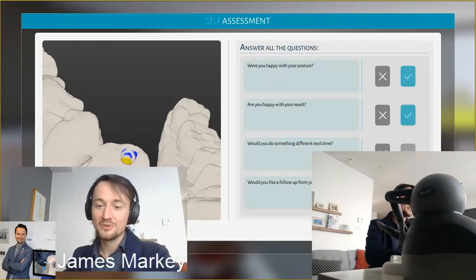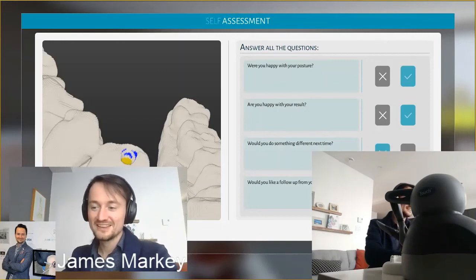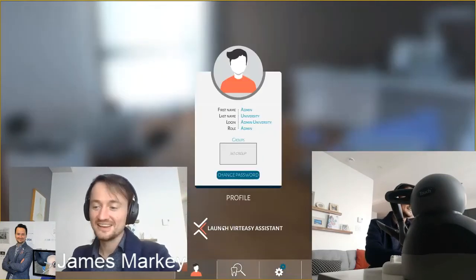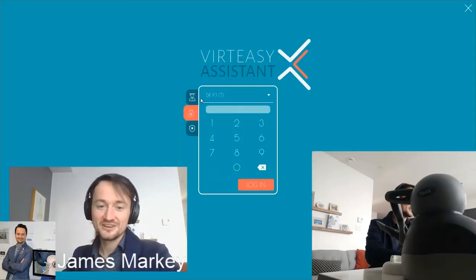So were you happy with your posture, your result? Would you do something different next time? Would you like a follow-up from your teacher? So when you finish this, it will actually send it over to Virteasy Assistant, and your teacher will be able to see your results as well as your responses. So we'll run through that workflow now. What we're in the midst of integrating is a direct launch to Virteasy Assistant. So the students from their simulator can log on, access the work they've just done.